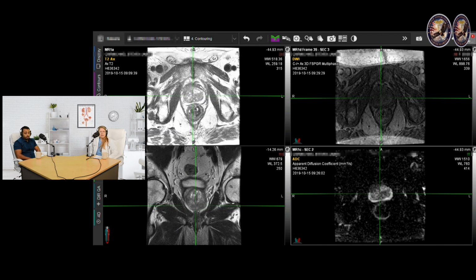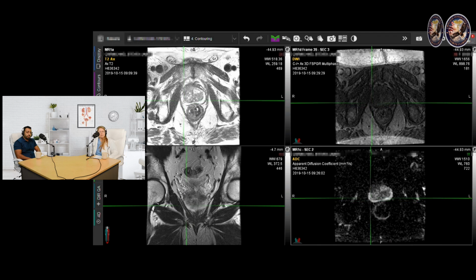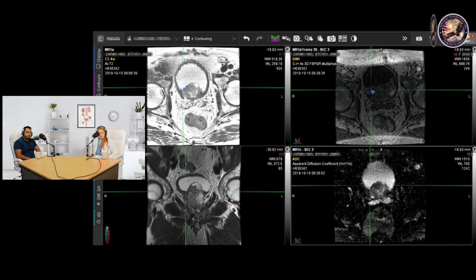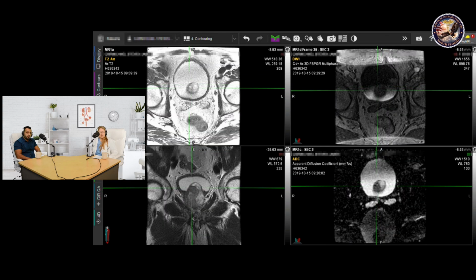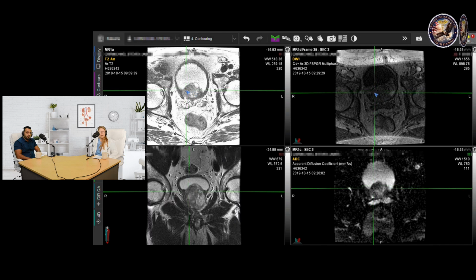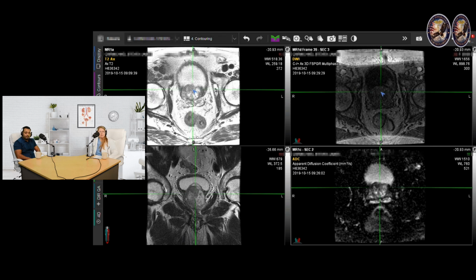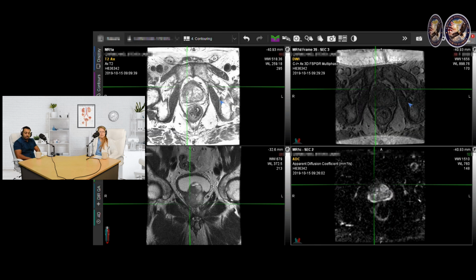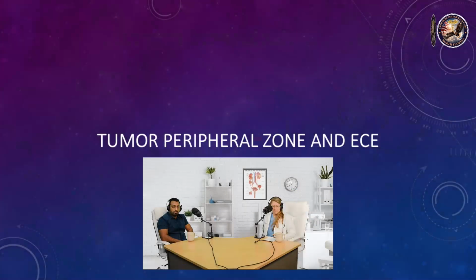The patient elected to have a prostatectomy. He had a negative metastatic workup, believe it or not, with a PSA of 39. And he had extracapsular extension and T3 disease already. So this was a challenging biopsy. We did an MR fusion biopsy on this patient, and it was done transrectal. The gland itself was 90 grams, and we were able to reach with a long needle this specific area in the biopsy. And we're going to go to the next slide.